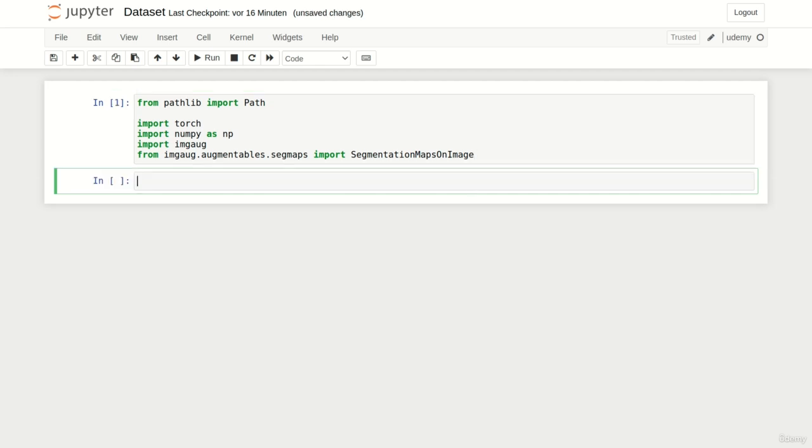Alright, let's go. Our dataset needs to implement the following functionality. At first, we need to create a list containing the paths to all two-dimensional slices. To do so, we will use the glob function heavily. Next, we extract the corresponding label path for each slice path. We can now use those paths to load a slice and corresponding segmentation given an index. After loading the data, we need to apply data augmentation. Once more, please make sure that slice and mask are augmented identically. Last but not least, we return slice and mask.